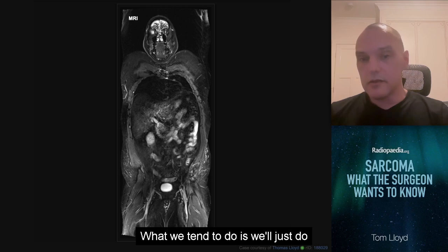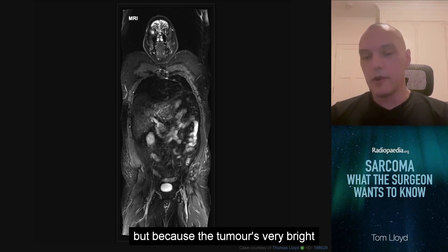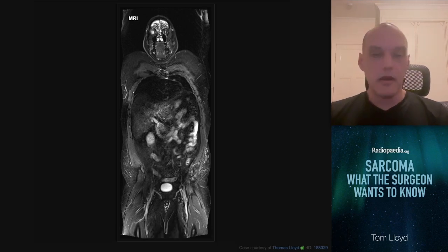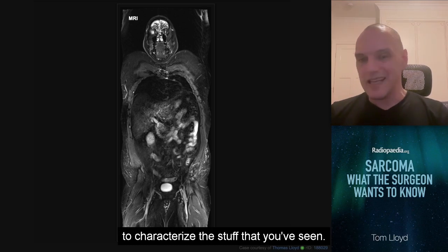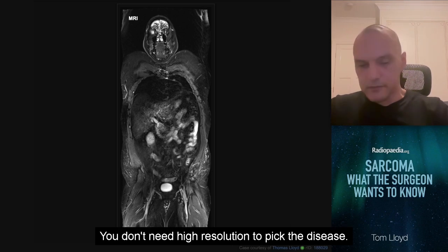What we tend to do is we'll just do coronal STIR sequences. They're fairly low resolution. They're quite dirty pictures, but because the tumour is very bright and it tends to go to bone, this particular tumour, because the disease is very bright, you can see it even on a low resolution fluid sensitive sequence. You then might do extra sequences to characterize the stuff that you've seen. So think of it more like a screening test, similar to a myeloma study. You don't need high resolution to pick the disease.